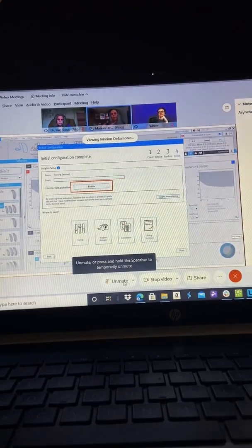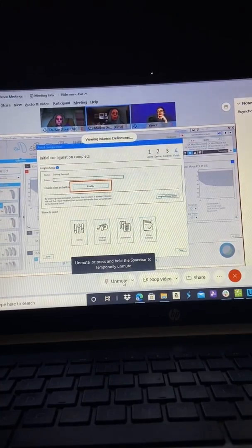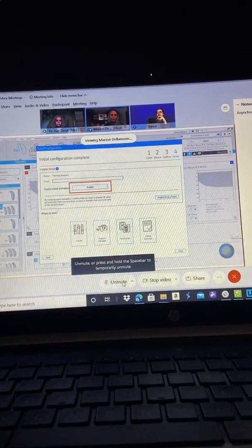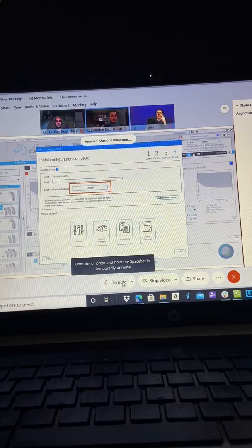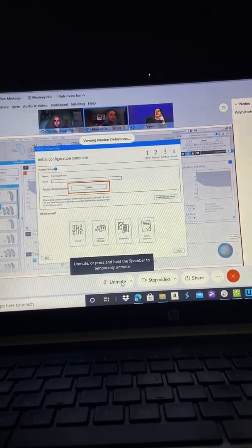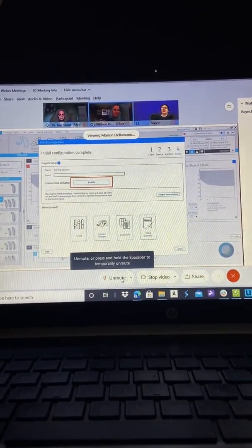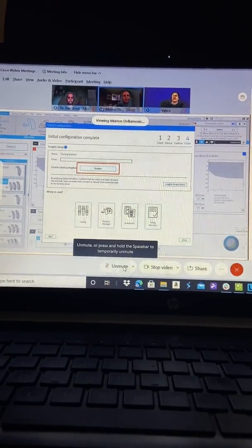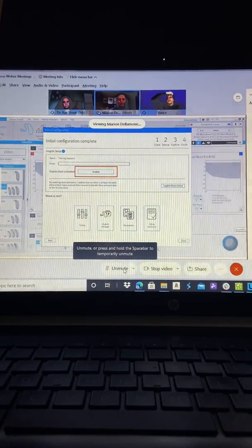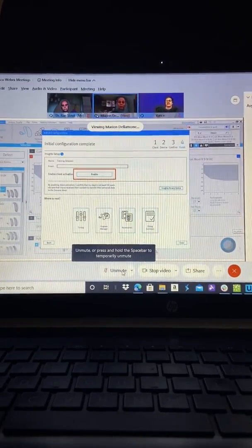There's 2 steps in this. So if they don't opt in on the app, then they won't have this anyway. So don't worry. I'm also going to recommend that you do not enter the email address, because it is almost completely unnecessary. I mean, for remote adjust, it's completely unnecessary. I think you mentioned that last time. I remember you saying don't enter the email address. Good, perfect, good memory there, Vance. Yeah, just don't do it. We used to use it a lot, but it's just a backup for a survey that we send, so it's really unnecessary. And that's it. That's all you have to do on the provider side.